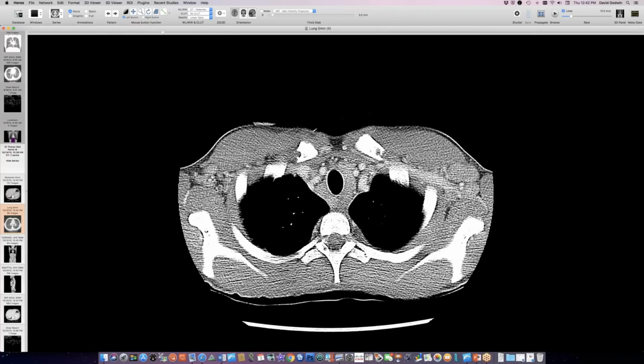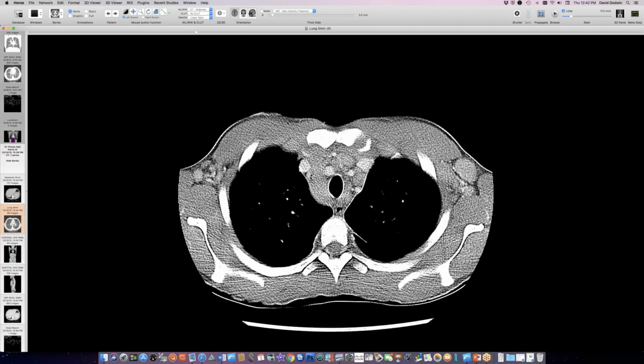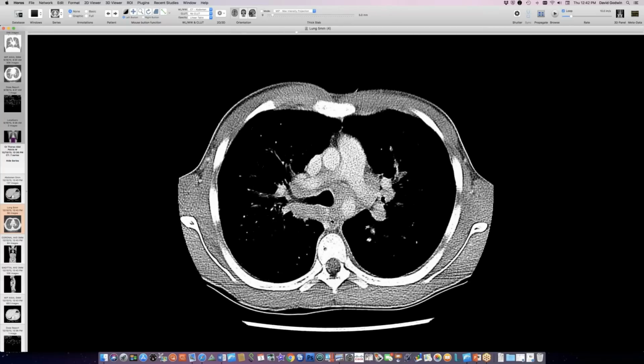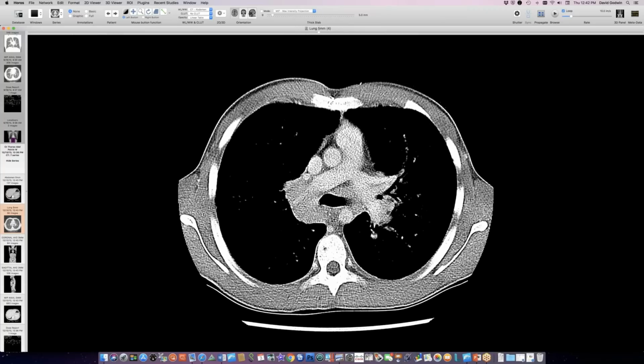No, I've never seen that extensive lymph node involvement with EGPA. I'm kind of skeptical that's what he has. I think he's got a lymphoproliferative disorder. It got better. Right. And then I would speculate that he probably doesn't have EGPA, because that's the primary finding. He's got a little interstitial edema, a very small amount of left pleural fluid, but the dominant finding is the lymph node enlargement. And no, I've never seen that with EGPA. And of course, not with the axillary disease. So it's fishy. It doesn't make sense that this is EGPA. So it may have fleas and lice.